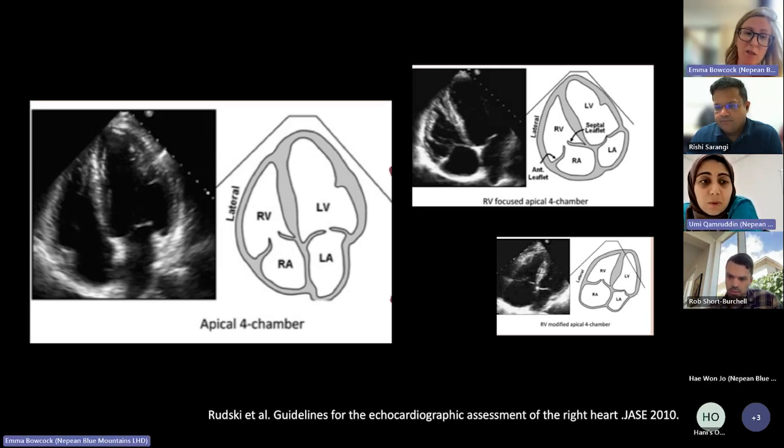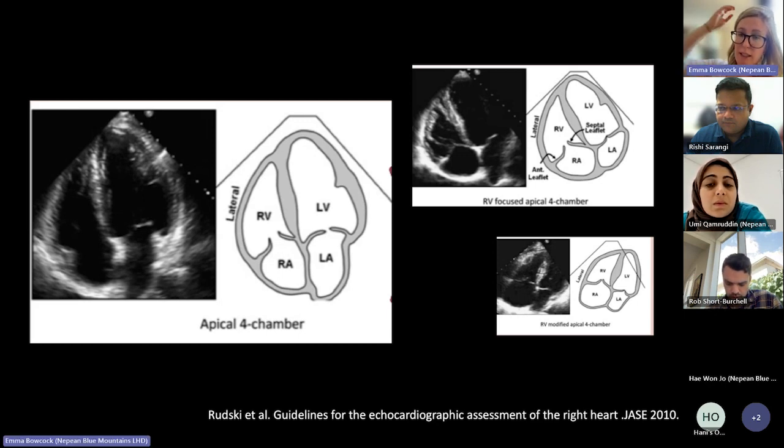I think it's like 4.1 at the base. Nice, very nice. Yeah, 4.1, more than 41 millimeters at the base, and more than 35 in the midsection. And the length, I always have 79, but maybe it's 83. Does anyone know? Ben, do you know the length? It's somewhere around 80 millimeters.